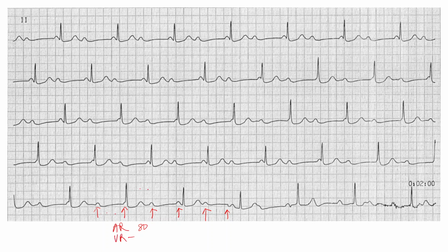Ventricular rate: 1, 2, 3, 4, 5, 6, 7. So 300 divided by 7, around 42. Ventricular rate is around 42. One more thing, next point is this is definitely a complete heart block. So there is complete AV dissociation. This is complete heart block, and you can see the QRS complex is narrow. So this is junctional rhythm. This is junctional escape rhythm, and normal junctional rate is around 40 to 60. So this is a normal junctional escape rhythm.